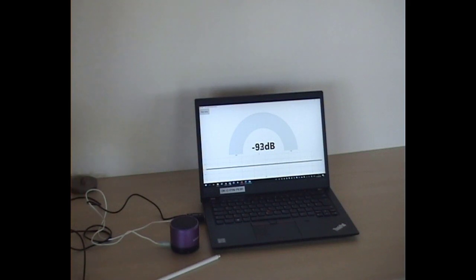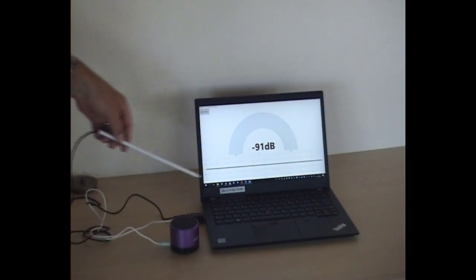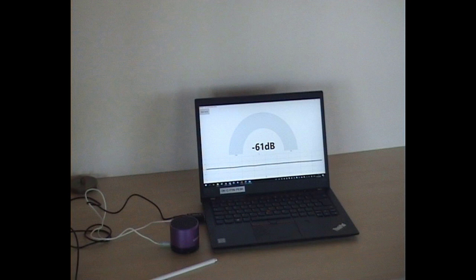But it's essentially the same thing, and then we can use the microphone just to test what the sound field is around the loudspeaker. Now, normally the loudspeaker is inside the probe along with the microphone, and so we are restricted to measuring the sound that is present right next to the loudspeaker. But obviously with this setup we can explore what the sound field is around the probe rather than being restricted.